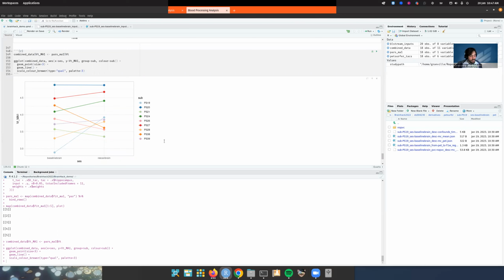So basically that's what I wanted to say. If you really want to do incredibly specific things with your blood modeling, bloodstream is probably not for you. Bloodstream is designed for those of you who want to have most of the functionality with the least of the effort. Basically it's streamlined. It can run everything from start to finish, generate your outputs, and you can do your modeling with that. It does most of the things that I would run in a normal analysis.